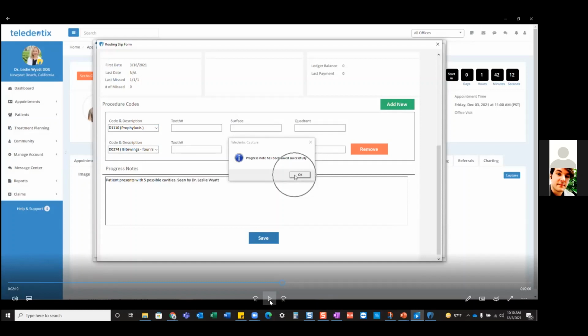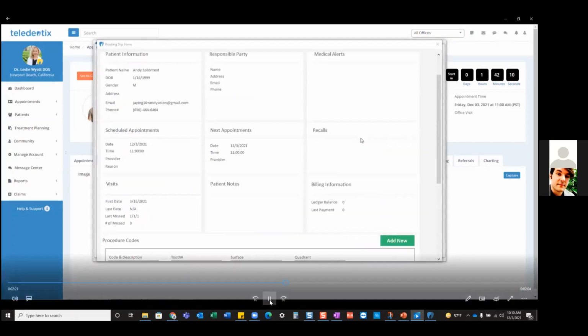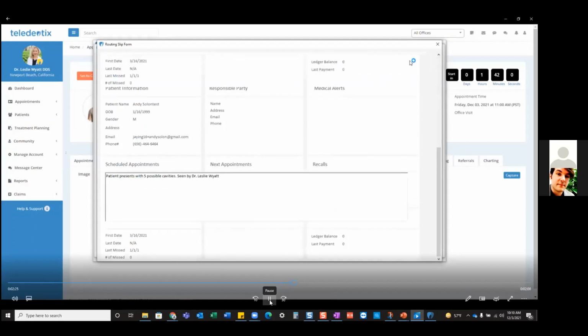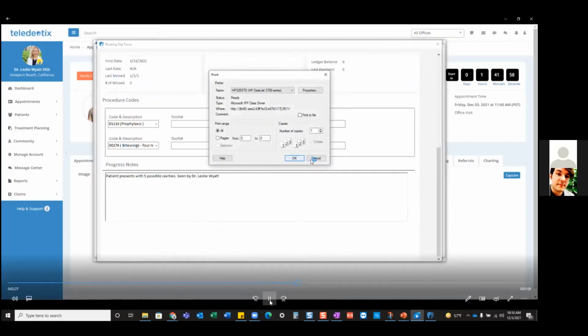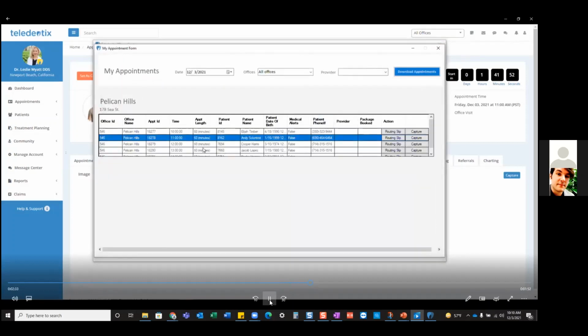And I mean, it's just one less thing that I have to write out on a piece of paper. It's in here. It's safe. I'm good to go. All right. Now, when I save, it's going to go ahead and give me that success message. So great. Of course, if you have connectivity to the printer, if it's connected directly, you can go ahead and print this. I know that a lot of you may go to locations where you have to leave a copy of that at the site. So you can definitely do that here.